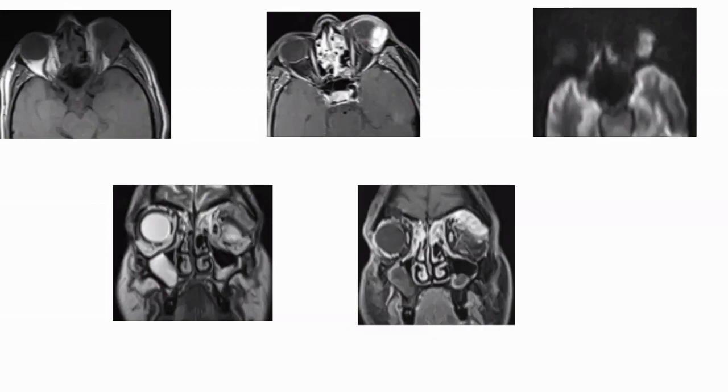So what is the normal anatomical organ in this area? Lacrimal gland. Yes. So do you think this tumor is coming from the lacrimal gland? It appears to be arising from the lacrimal gland. Okay. So what is your differential diagnosis? Yes, sir. What is your differential diagnosis in this case? Lacrimal gland, so much enhancing mass lesion with restricted diffusion. My first diagnosis would be lymphoma, mucoepidermoid carcinoma.